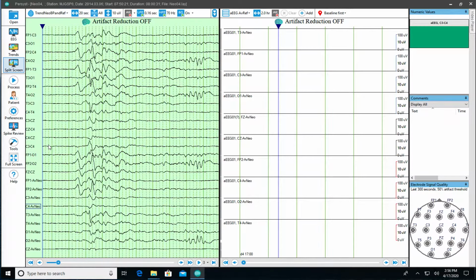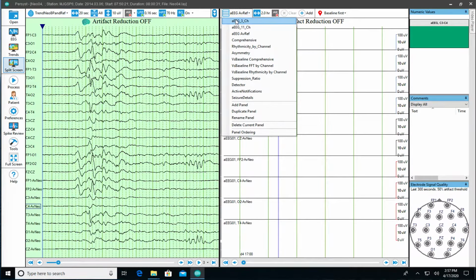Now, again, importantly, if you've got open amplifier inputs, if you've got two channels on the scalp, 4 electrodes plus a reference, possibly a ground depending on the amplifier, and you switch to a trend panel that has 11 channels, well, if you're not recording them, of course, that's just going to be noise in those trends. So, stating the obvious, but if it's a two-channel EEG, stick to the two-channel trend, and we're going to add another trend panel to this.